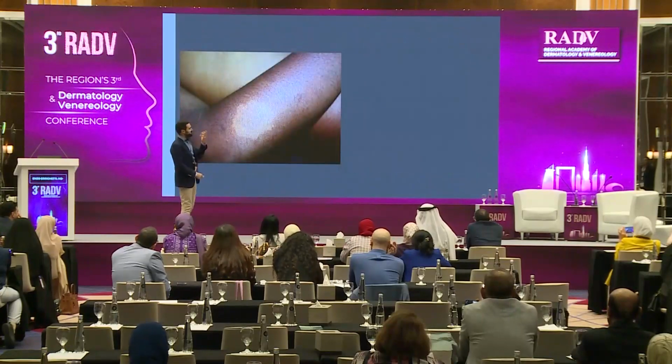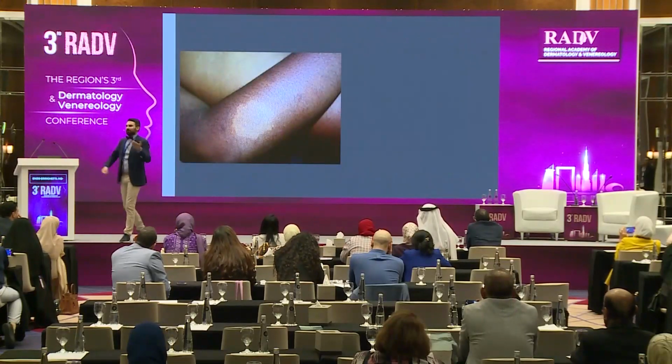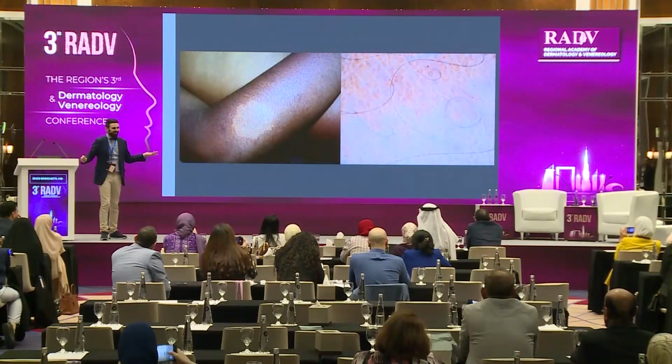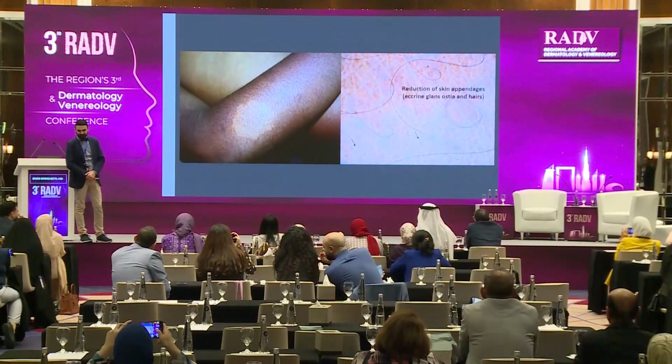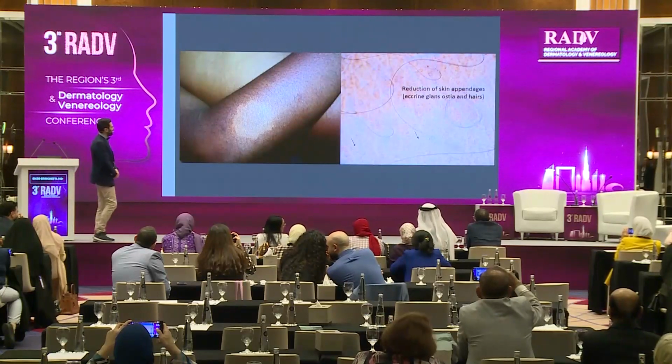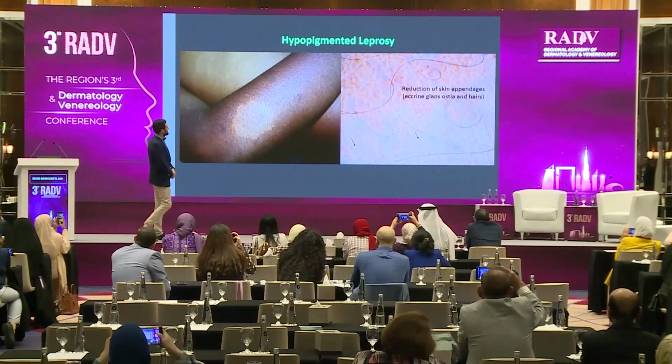Okay, and this, Jesus. Leprosy, because we have a reduction of skin appendages. Okay, great.